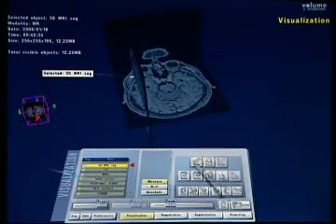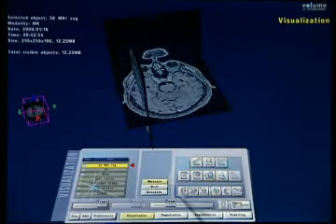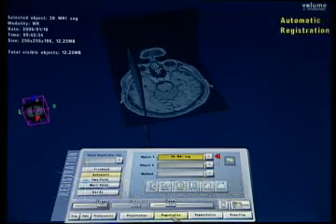And I have tools here like measurement, curved measurements and linear measurements, and angles I can measure. I have cropping tools, volume exploration tools, cut tools. You will see me using those, and the others, during all the presentations. I have tools for visualization, for data co-registration.